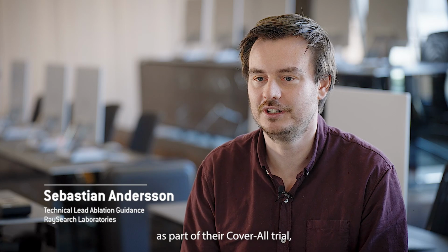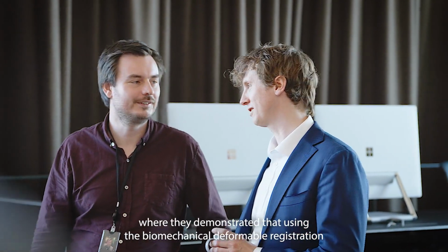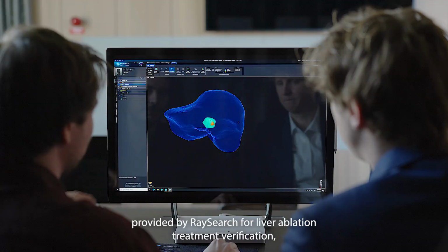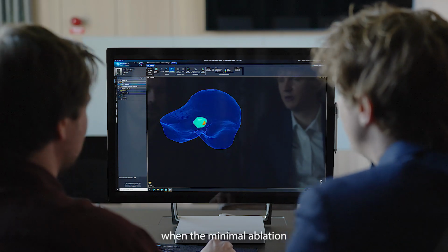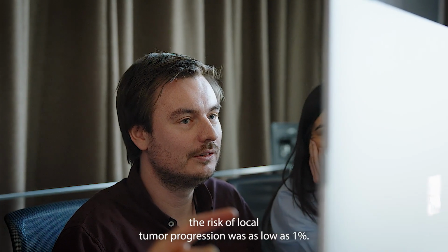So this module is based on research conducted by MD Anderson Cancer Center as part of their COVER-ALL trial, where they demonstrated that using the biomechanical deformable registration provided by RaySearch for liver ablation treatment verification, it reduced the risk of local tumor progression. When a minimal ablative margin of at least 5 mm was achieved, the risk of local tumor progression was as low as 1%.